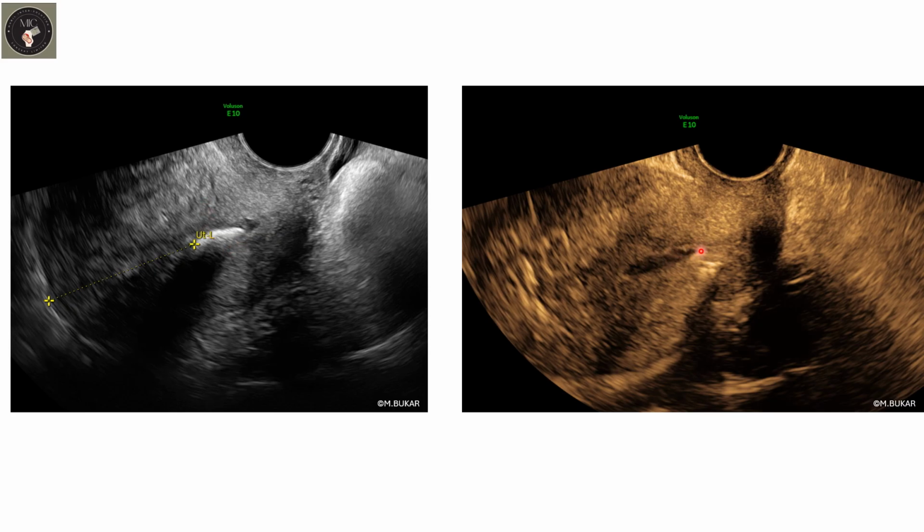So it was removed. And the surgeon told me that he felt something hard, but they couldn't see any bone. So he dissected the area, excised the area and sent it for histopathology. And then he put an IUCD. And because of the difficulties encountered at surgery, the adhesions and all that, you can see part of the IUCD within the substance of the posterior lip of the cervix.